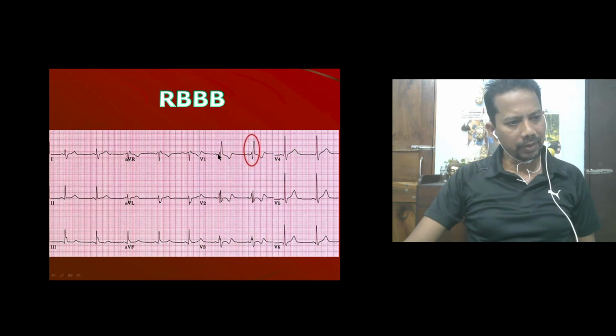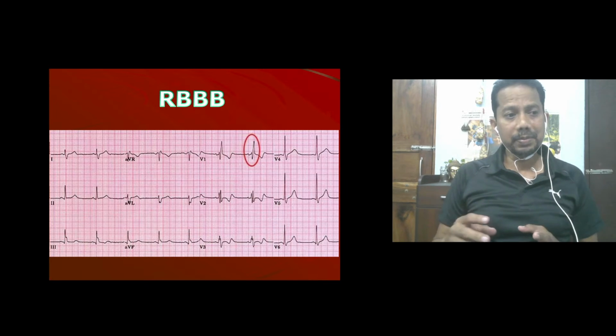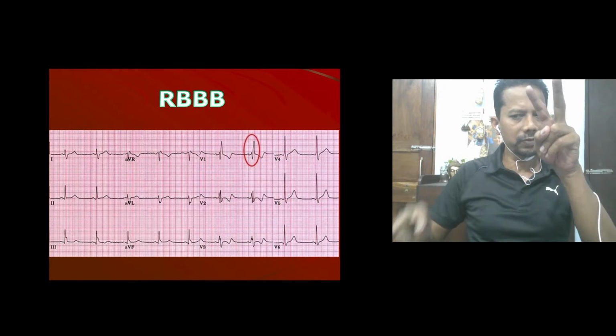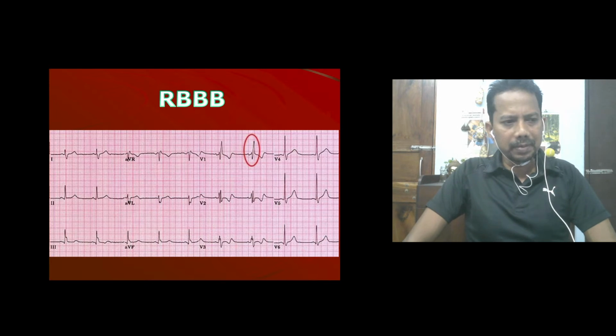Okay. Now can anybody tell me anything in this ECG which is contradicting the criteria of right bundle branch block? I said in LBB tall R in V5, V6, deep S in V1, V2; in RBB tall R in V1, V2, deep S in V5, V6, and broad QRS, and in RBB there is RAD, in LBB there is LAD. So can anybody tell me what is the problem in this ECG?